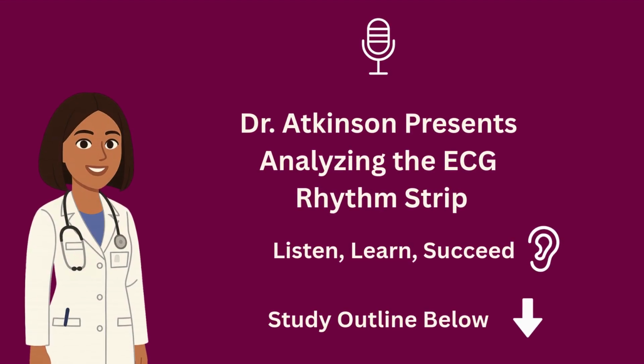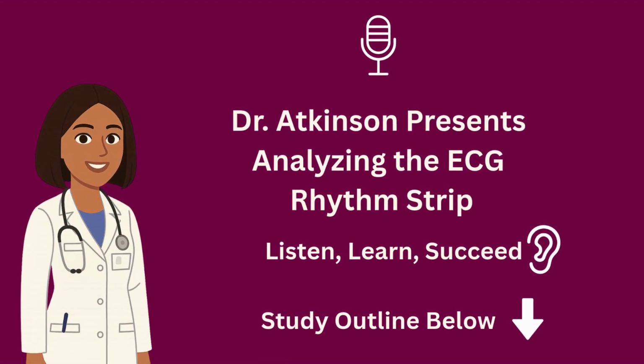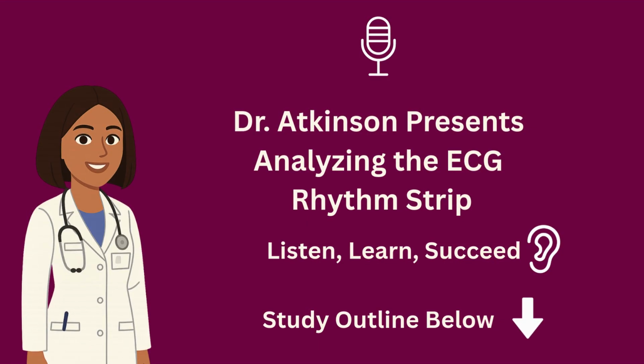When we look at an electrocardiogram rhythm strip, our goal is to analyze it systematically. This allows us to determine the patient's heart rate and rhythm, detect arrhythmias, evaluate conduction disorders, and even identify evidence of myocardial ischemia, injury, or infarction. The rhythm strip isn't just about numbers and waves on paper. It's about connecting what we see to how the patient is doing.